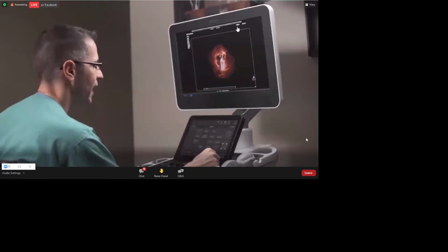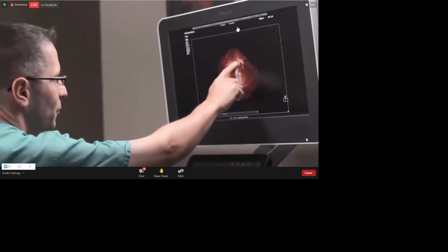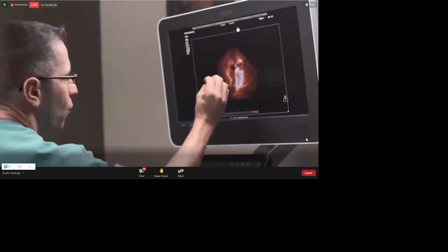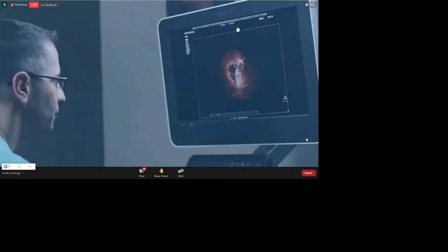And the light here in the left ventricle, as we've placed it there, allows us to see an illuminated left ventricle, the mitral valve. And what's very interesting to me is that the light actually penetrates into the left atrium, illuminates the top portion of the wall of the left atrium, but does not at all enter the right ventricle with no penetration through the ventricular septum, so that the light is actually acting as it really would if I put an orb of light within the actual cardiac volume. This personally helps me have a bit more confidence that there is no evidence of ventricular septal defect, and if there were, we would anticipate seeing light emanate into the right ventricle.